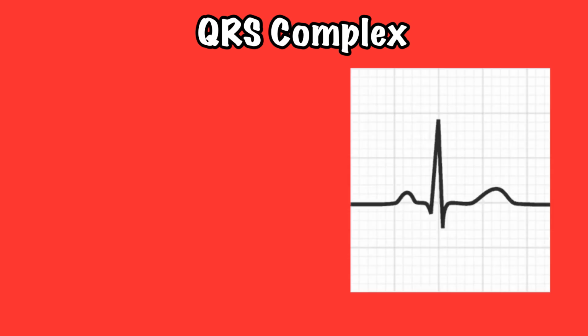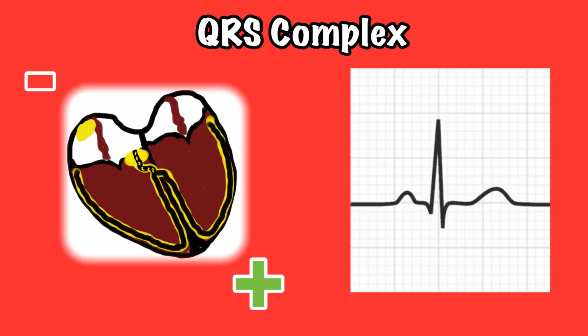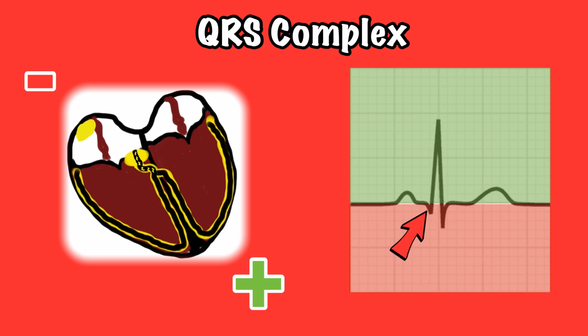Focusing for a second on the shape of the QRS as it relates to lead 2, the QRS has portions above and below the baseline, and that's because the bundle branches carry that impulse in different directions along the path. Initially, we see a negatively inflected portion. That's right as the impulse is releasing from the bundle of His, and there isn't a lot of space here, or aggressive directional movement. It shows up as a small negative inflection, implying more energy is moving up than down, before it really breaks into those bundle branches.